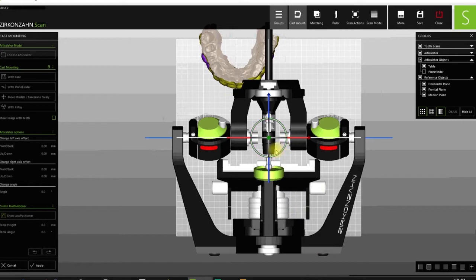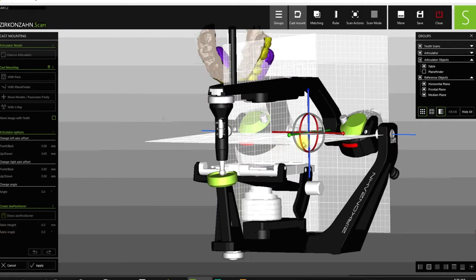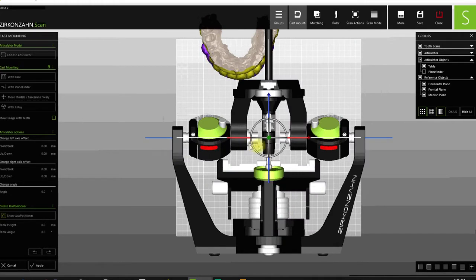And then now I'm going to grab the front of this wheel. If you turn to the side a little bit, you can see that me grabbing the front of that is actually the pitch. So I'm going to change the pitch of it with that. So see how I'm doing pitch. But when you're looking straight at it, it's hard to see that, but it's there. If you want to move it up and down, you grab this one. If you want to move pitch, you do this one.